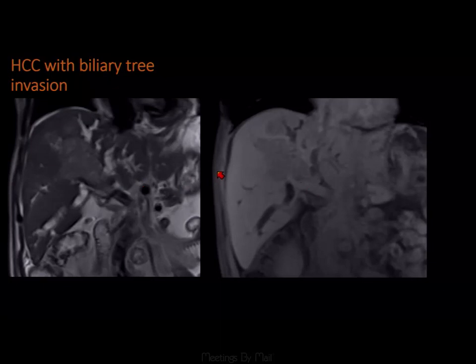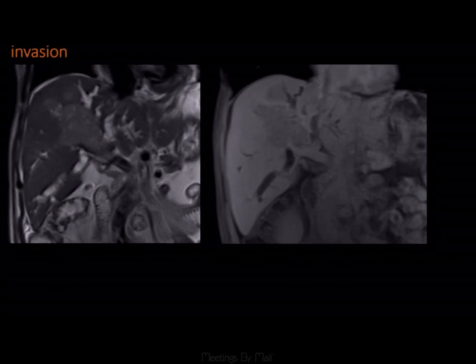The patient had a 2-year history of treatment for HCC with Y90, and the tumor came back as a recurrence and actually became like an infiltrating lesion. And you can see it's completely replacing, actually invading into the portal vein. There's no flow void, and you can see marked intrahepatic ductal dilatation. We didn't do biopsy at this point, but presumably this was an HCC which turned into a poorly differentiated HCC with biliary dilatation. Again, in these cases, you have to rule out the possibility of cholangiocarcinoma.